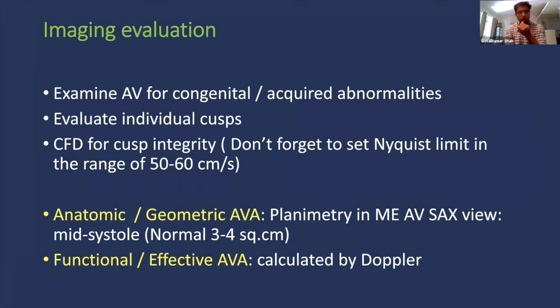So in our system for evaluation, examine the aortic valve for a normal three leaflets or any congenital or acquired abnormalities. Evaluate each and every individual cusp.